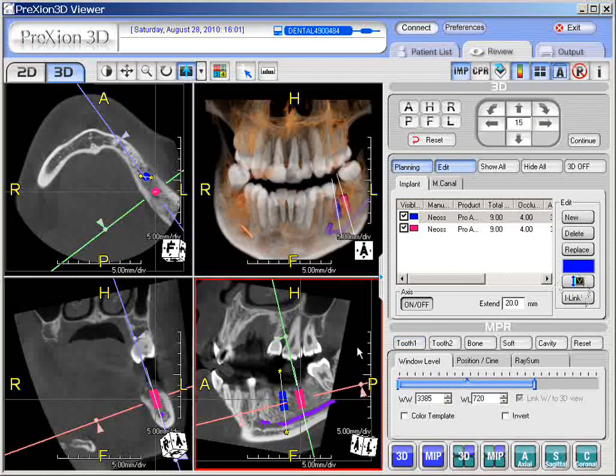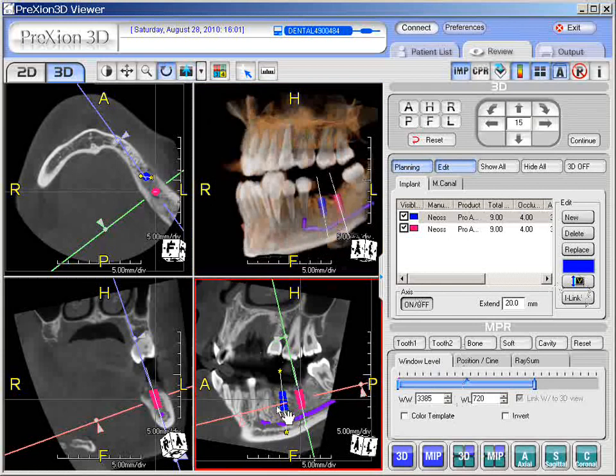Okay, that function. Also down here, you could change the axis. This is for the 3D, and also for obviously the linear line. If you want that off, you can simply remove those. Okay. Now remember, it's down here. It's implant specific. Now you can also extend this, or reduce it. See this number here. You can fill in a separate number instead of 20. You can make it 15, and it'll reduce the length of the linear axis line. It goes right through the implant. So that's what this does here.